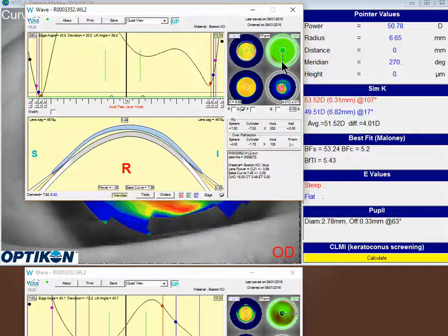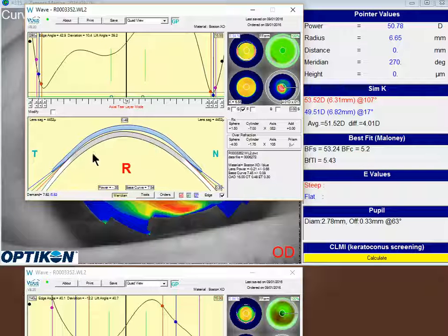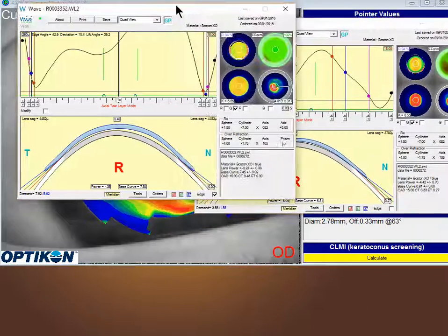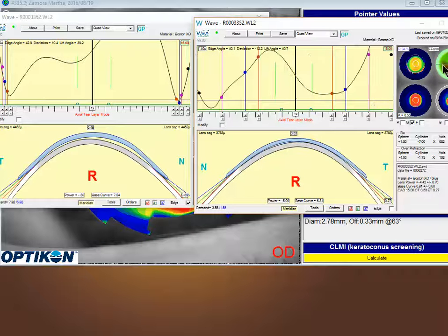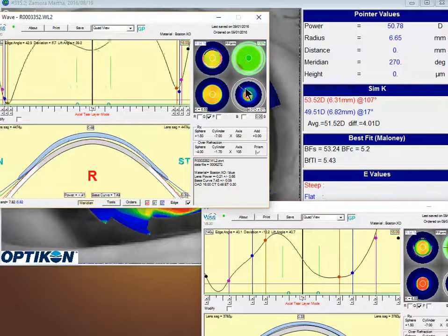And you'll see once this gets done designing, you'll see a little different looking lens. Now when you look at this lens, you've increased the sag considerably. You also have a little more clearance here peripherally, and you'll notice just from the representation in the Wave design, you have much more clearance centrally. Now compare that to your lens. This is your original lens here next to it, and you'll see that you're rather snug all the way through the central area. If you look back at this new design, you pretty much have clearance all the way around.